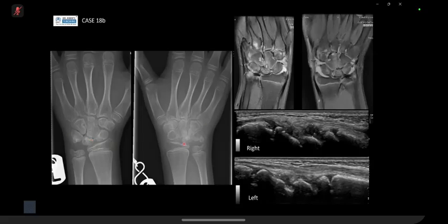On the left and on the right, you can see there is a widening of the scapholunate. You've got the subluxation of the capitate, all looking a lot like what you think in rheumatoid arthritis if it was in an adult. Similarly, the changes on MR show the bilateral joint effusion. All these little cystic-like appearances could be subchondral cysts, or could represent erosions more than subchondral cysts. Probably erosion given the extent of disease.